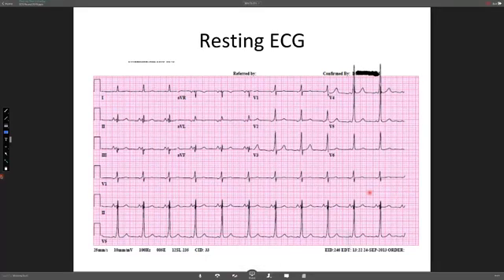I was wondering if you could make any comments about this ECG. So I'm not giving you any question here. I'm just opening the floor for comments. Any abnormality? Is this a normal ECG? Do you see anything interesting? So we'll wait for 30 seconds for comments.